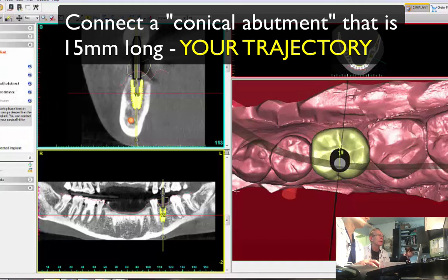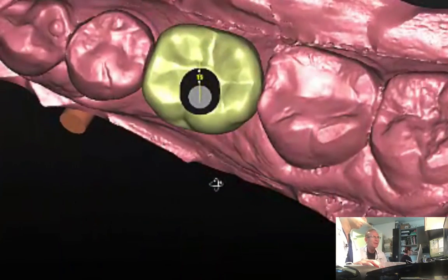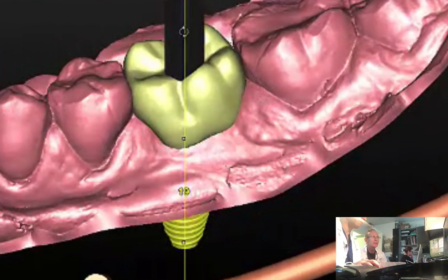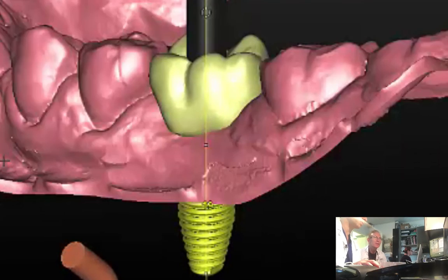So what you have poking out. Yeah, it's going to poke out, and it's going to show us the trajectory of the implant. And it'll show you where it's occluding against the top tooth, in that cross section, because we have the iTero, which shows us the opposing. But that we keep for the end. Let's call it the final touches. We don't need it right now.